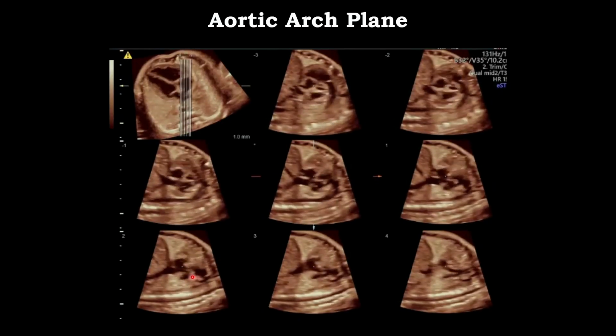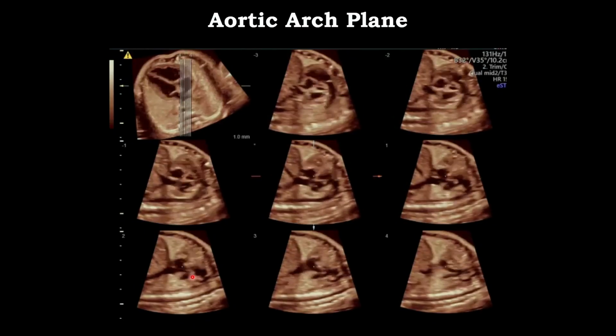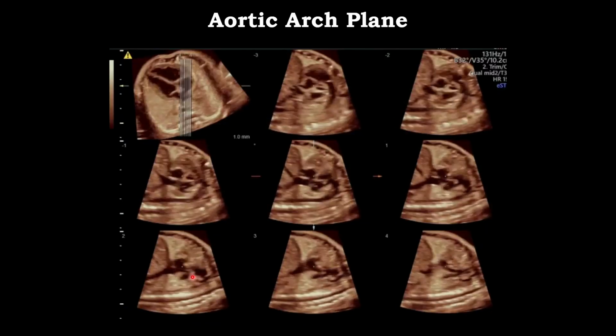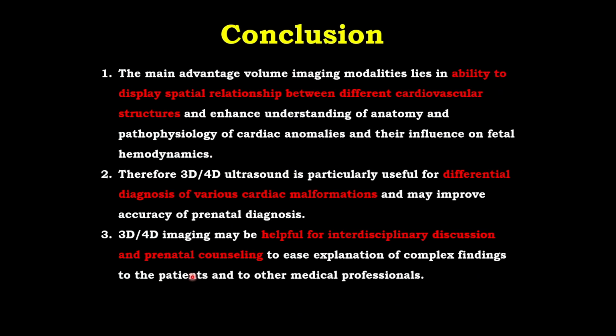So this is the automation, and these are very rapidly developing technologies. I think this is definitely worth exploring to improve the detection rate and improve the way you document your images, and again get extra confirmation and confidence in your diagnosis.